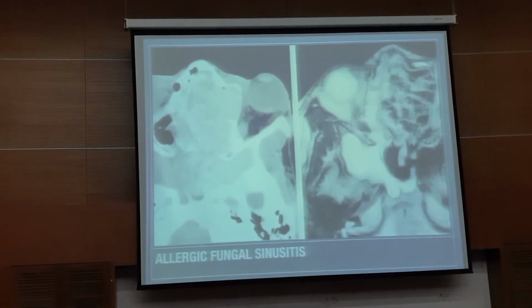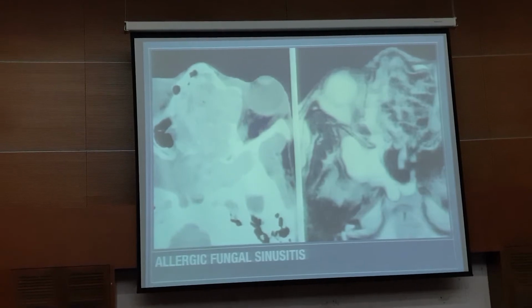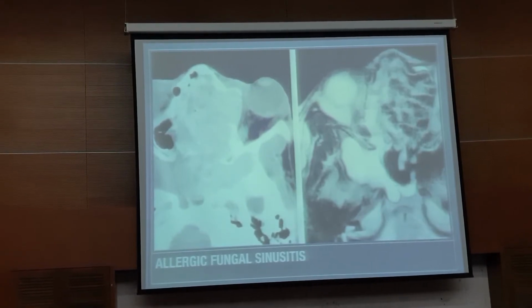Can you see here that even the ethmoid sinuses are grossly enlarged, and the sphenoid sinus has a lateral canal there. A lot of hyperdensity here, and I think the patient did have symptoms that fit this pattern. And on MR, interestingly, you will see areas that are hyperintense, which indicate fluid, but also some areas here. This is the same patient.